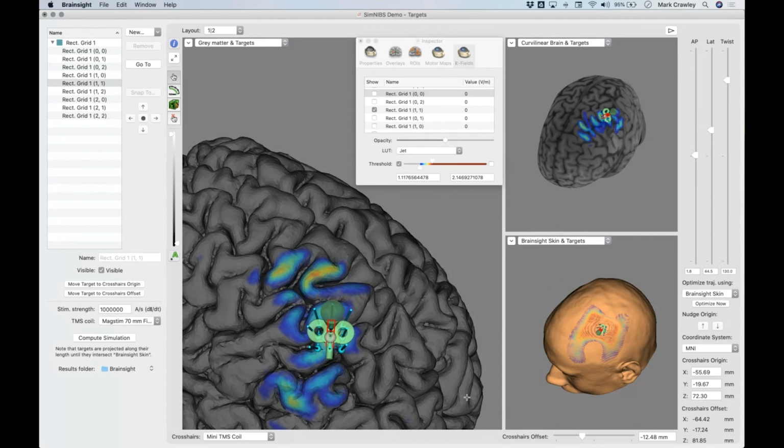This question now, I can see the answer directly in front of me on the screen, but it'd be good if you could point it out. In SimNIBS, you need to fill out dI/dt for simulations. We're big fans of dI/dt at Brainbox, as it's the most accurate, and the only accurate, way to calculate the intensity of a coil. Do you need to specify dI/dt in SimNIBS in Brainsight as well? Yes, if I wiggle the mouse around here and highlight this, you do. If you don't have it, like I said earlier on, use this figure in here as a reference. But obviously, if you can put in your exact values, you're going to get more accurate models.